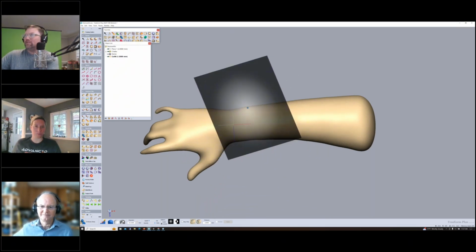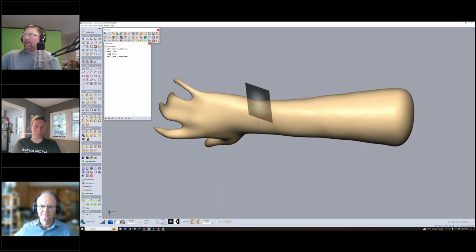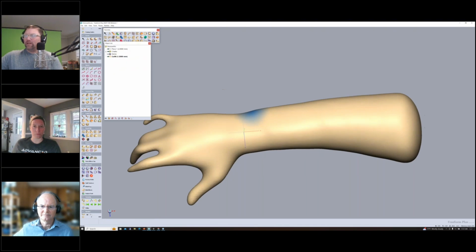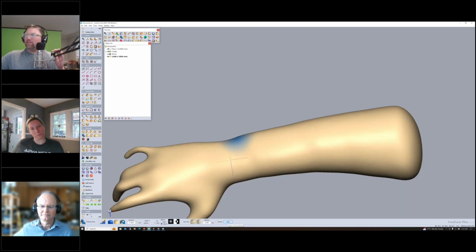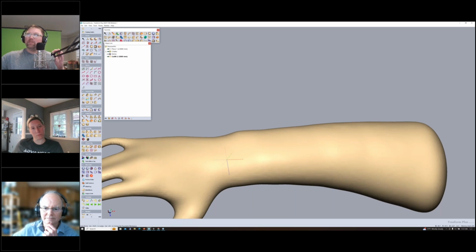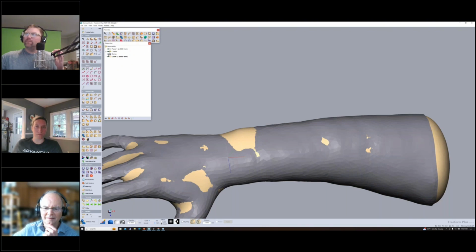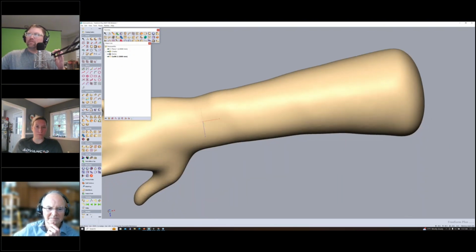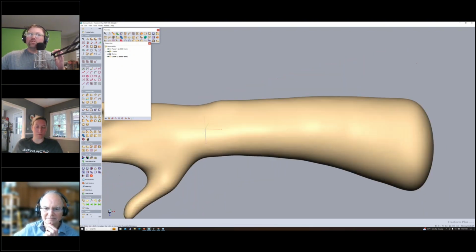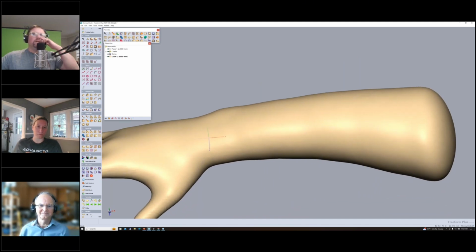And it allows you to place or mark an area using that gradient on the styloid process. And then we're going to increase it in size. And the beauty is, I just increased it 3 millimeters. And to show you that I did do that, we have a build up there. So we increased it 3 millimeters, but there's no smoothing that's going to need to be done there. It's all nice and smooth already.